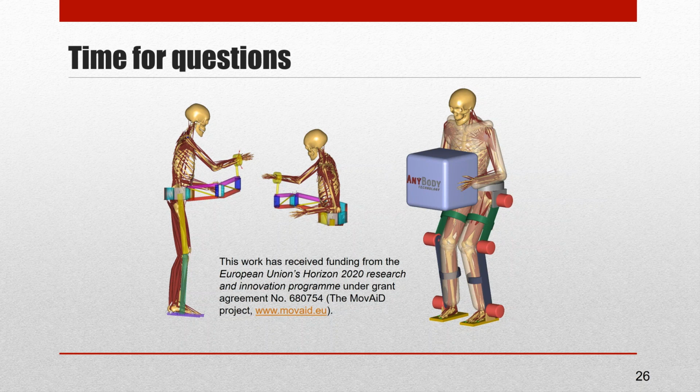These reaction forces would influence balance and muscle recruitment and possibly also the forces that the exoskeleton has to provide. That will come automatically out of the equilibrium equations.